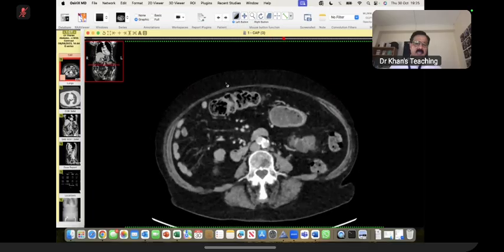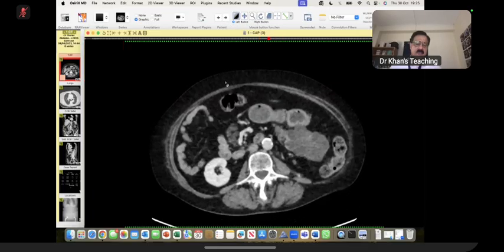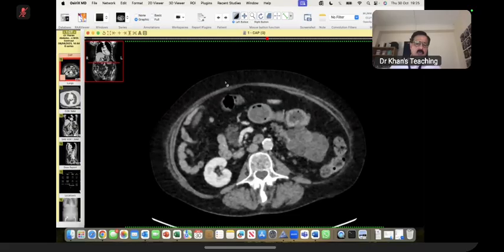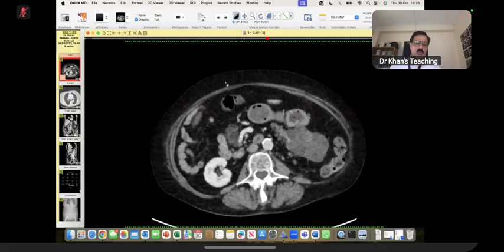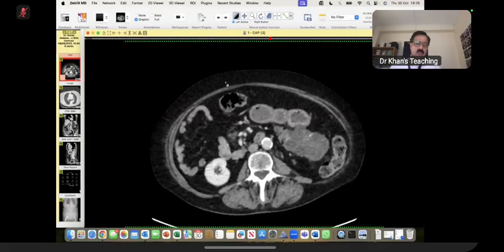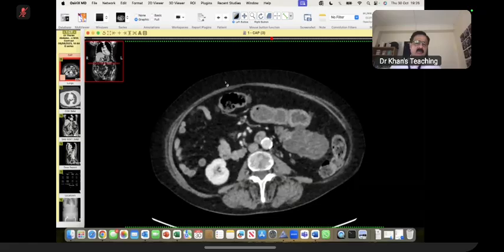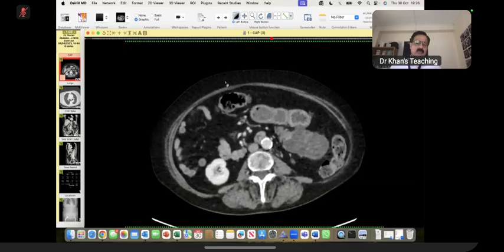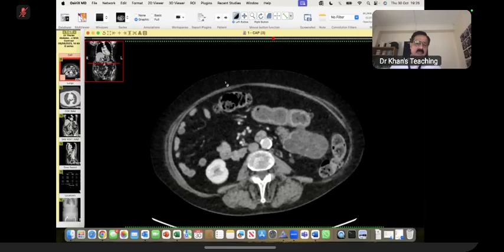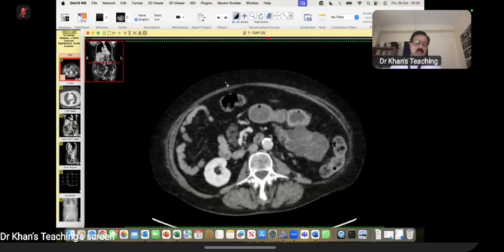So here again, my same feedback which I told you in case number one. You go into rounds. You have to learn to close the case and just give a diagnosis, because here also, even going through all of this, then you ask for an MR much later. So let me tell you the theory behind serous cyst adenomas.